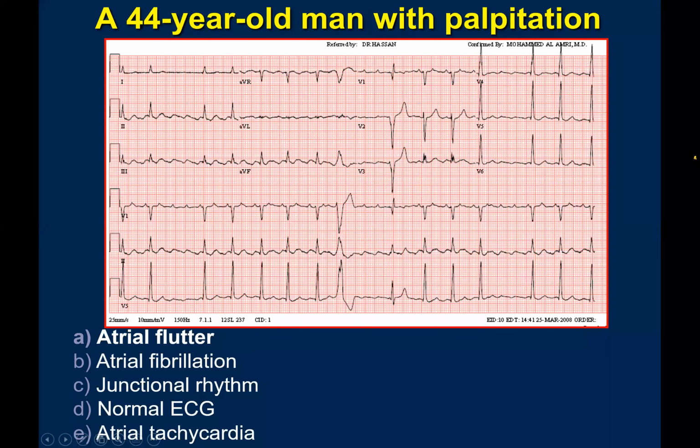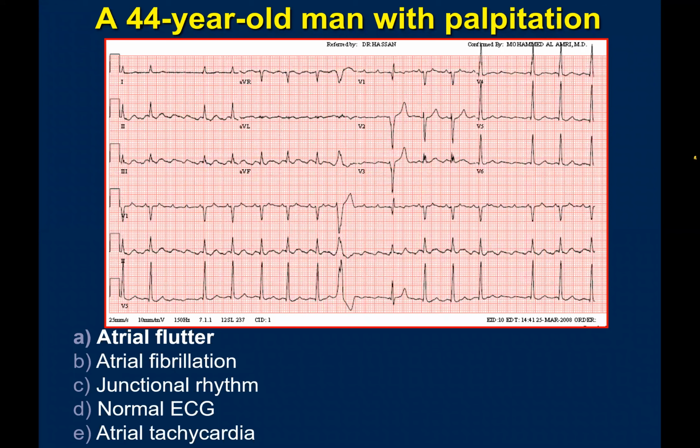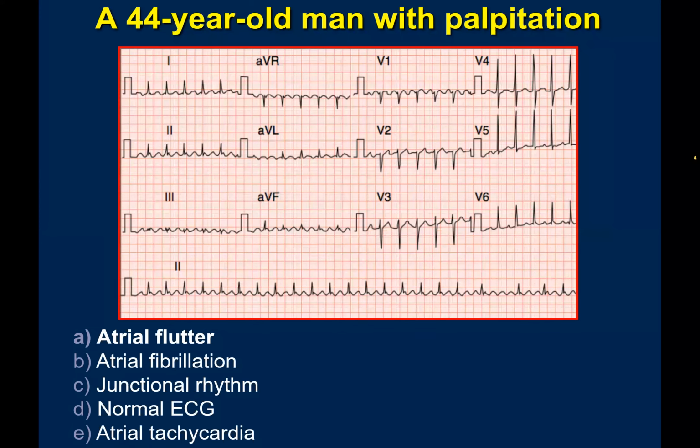Doctor, I have one question regarding the previous image. This one or this one? No, the one before, the first atrial flutter, before the adenosine. This one, yes. I cannot see it, but in the first one, in the atrial flutter, the strip rhythm in lead 2, the last 4 or 3 beats are different from the chest leads in V5 and V6. Why is that, the morphology?